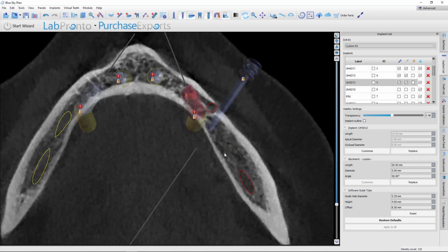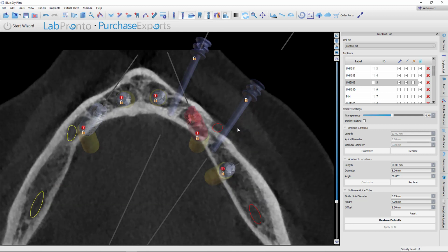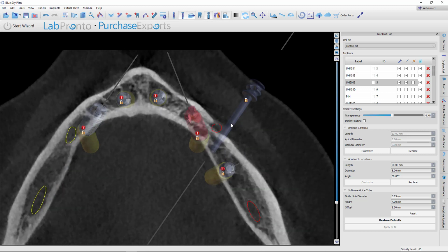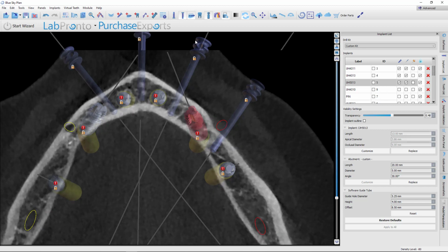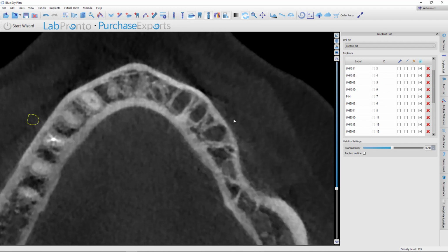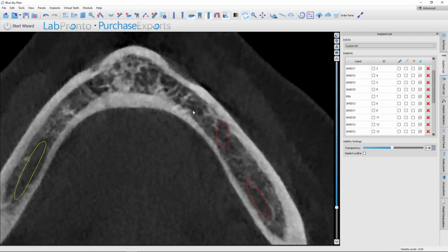And if that were in fact an anterior loop, remember it was going way up here and then coming back. It just doesn't do that. Anatomic studies show that it's almost never beyond 5 millimeters, and generally it's far less than that. So what you're seeing there, and this is typical, is as you go deeper, you'll see that nerve taking off down and towards the mesial. I'm not sure if we'll be able to make it out here as we get deeper. And you can start to see it right here, but all this is the continuation of that mandibular canal that's going up here to give blood supply and innervation to the anterior teeth.